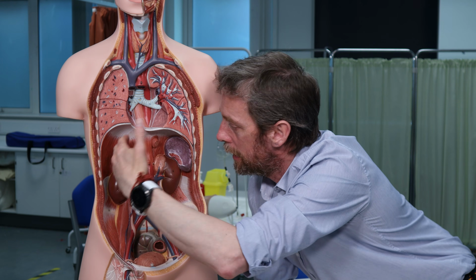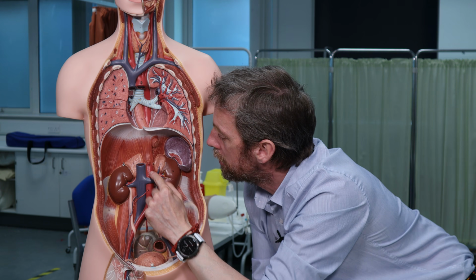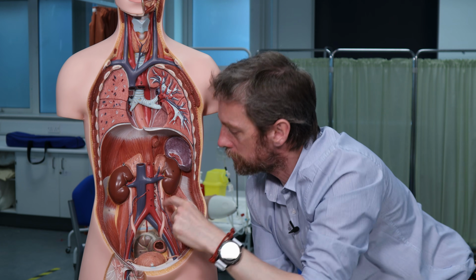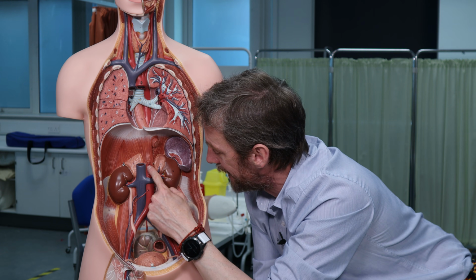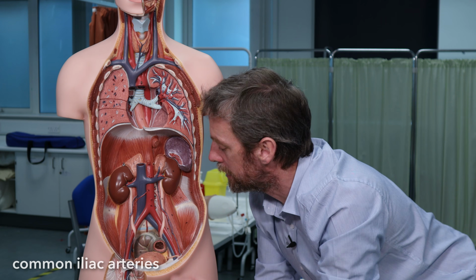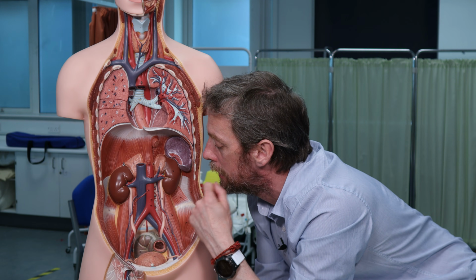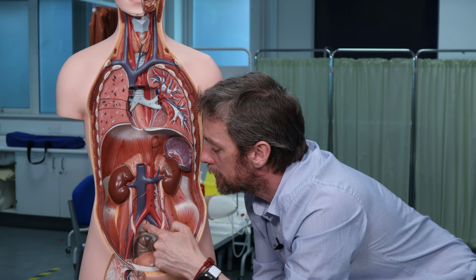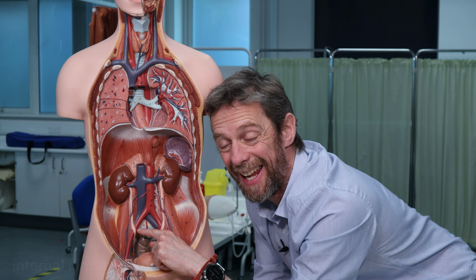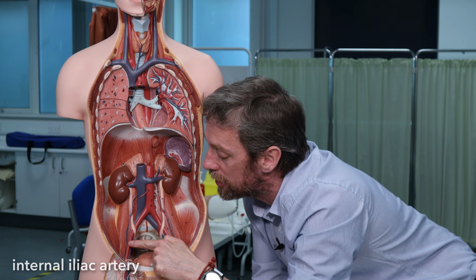So the diaphragm is up here. Notice how it's nice and curved. And the aorta is appearing through a gap between these two legs, the crura of the diaphragm. So the abdominal aorta descends, and it ends by dividing into two common iliac arteries that continue to descend, but they're running a little bit more anterior now. And they divide on both sides into an internal iliac artery that goes into the pelvis and an external iliac artery that continues down into the lower limb.